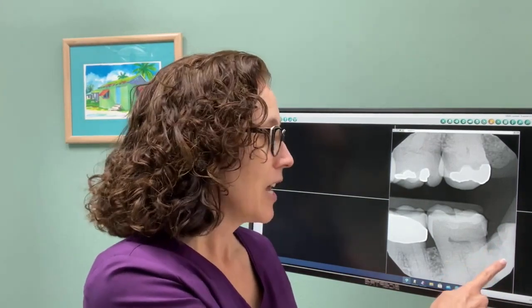So if you were to look inside the patient's mouth, you would only see gum tissue there past the last tooth, and it's way far back there. But with the x-ray, you can see that indeed that person has a wisdom tooth back there, the very last tooth back there. On the back side of the last tooth that's in the patient's mouth, so if you're brushing or looking at the teeth, the very last tooth back there, one of the things you're able to see here on the x-ray is a couple of areas of calculus right here and here.